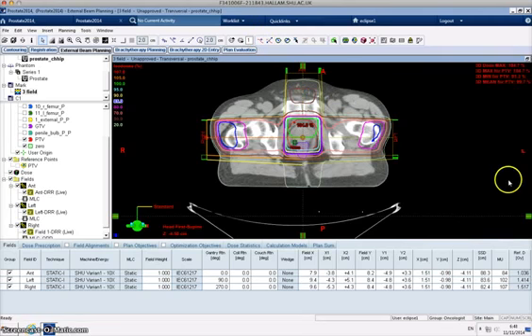So I want to reduce the dose along here, because this is too much. But we can't just get rid of dose, we have to move it from one place to another. So I'm going to propose to minimize the dose here, and to do that I'm going to increase the dose up here.